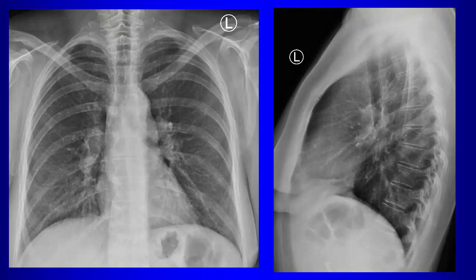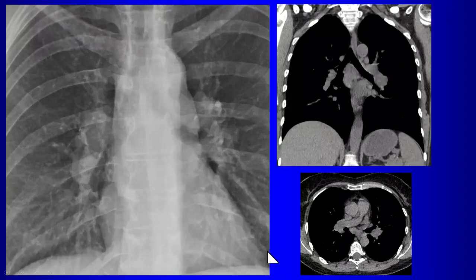Yes or no? No? Right here. Yes. See that? There is something bulging out. These hila are too. What do you think this patient's problem was? This is sarcoid, right? This is a case of sarcoid with subtle hilar lymphadenopathy, right? See this bulging? That's not normal. So this patient has bilateral hilar nodes from sarcoid.